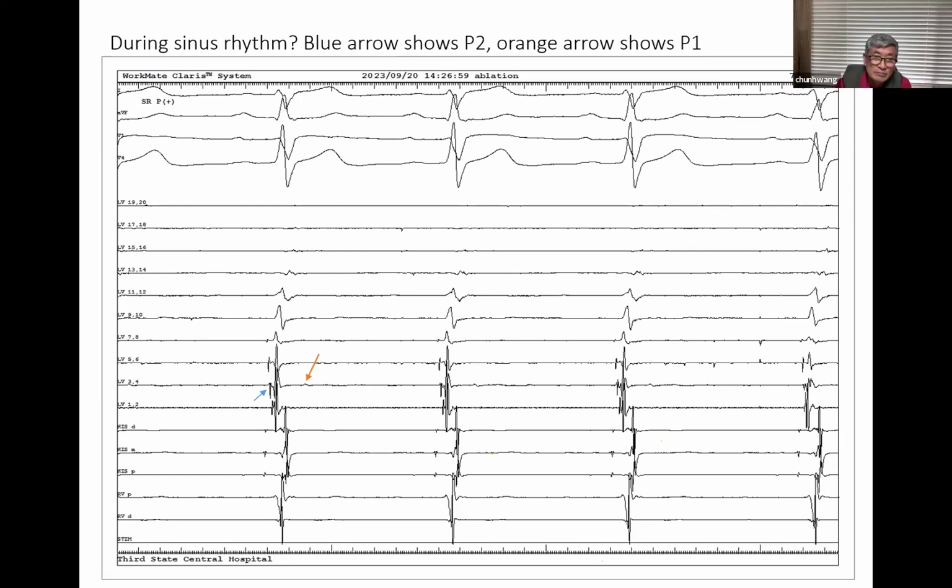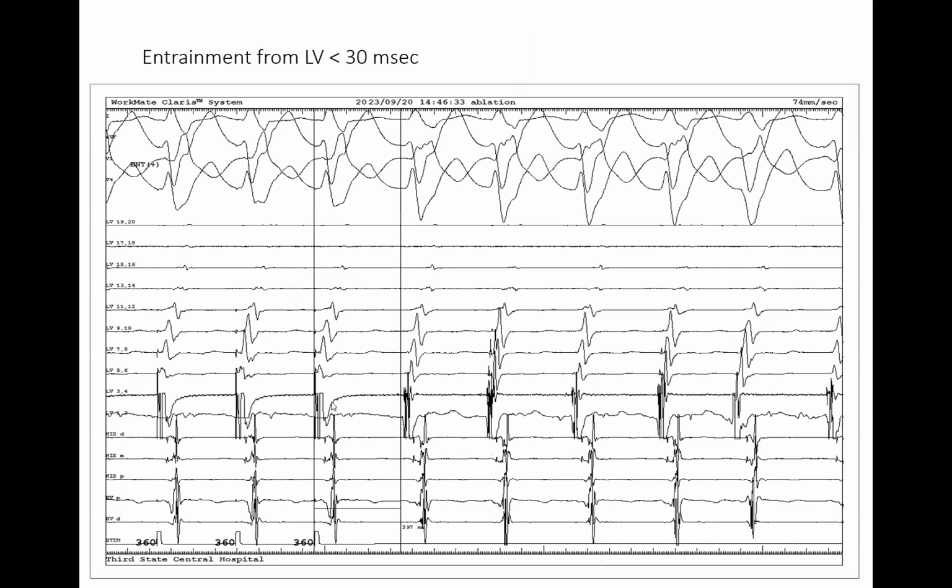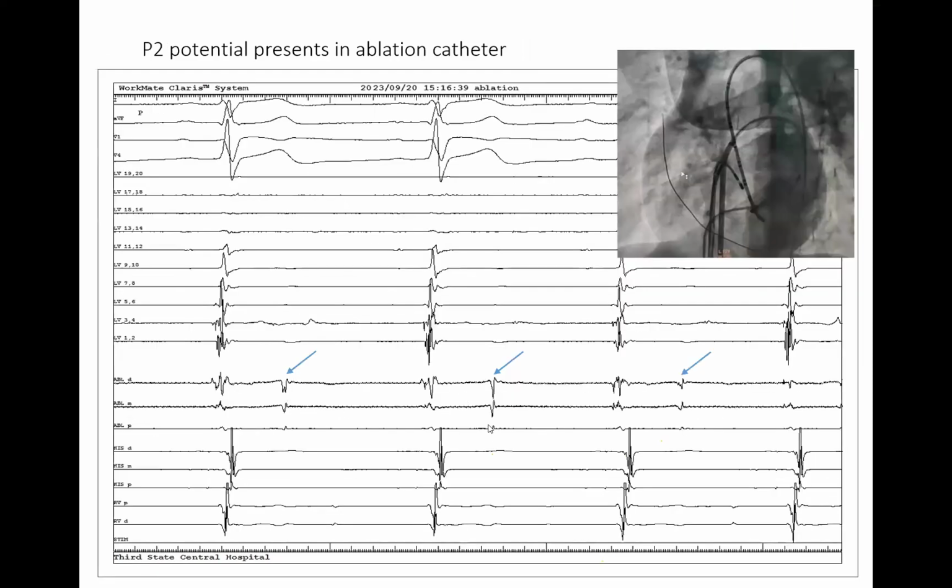Go to the ablation signal. Your ablation signal was much more beautiful and bigger. Right here, and I want you to stay there. Look at the mitral valve, LV 3-4, channel 3-4. What do you see? Those signals again. There are two signals there. Go to the next one, and now go to the next signal. Right there, 1 and 2. Opening and closing of the mitral valve, far-field signal. What is that biggest signal showing you? Do you know what that is? It's a papillary muscle contraction artifact.